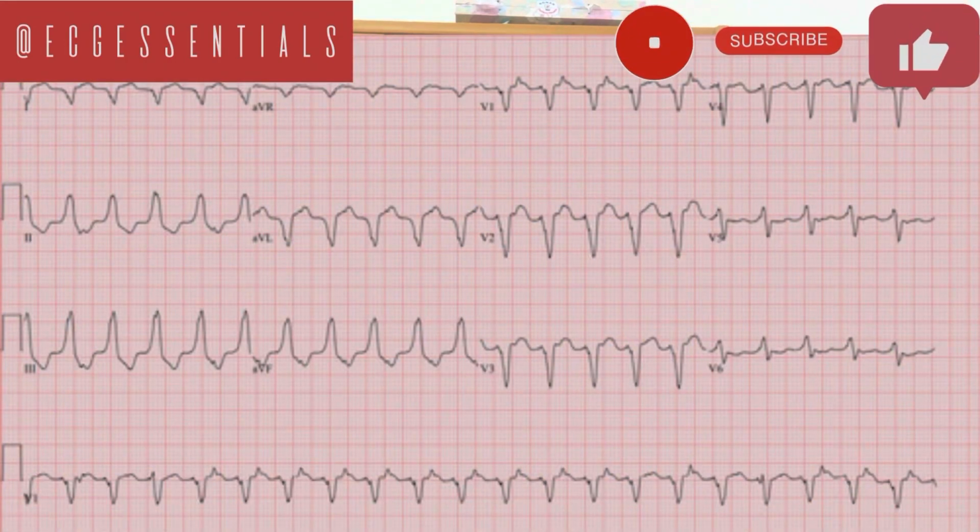If the QRS complex we find is not narrow but is broad, then two things may explain it. It's either the rhythm is of a ventricular origin, coming directly from the ventricles, or it is actually a supraventricular rhythm, but there has been an aberrant conduction during the channeling of that electrical activity.